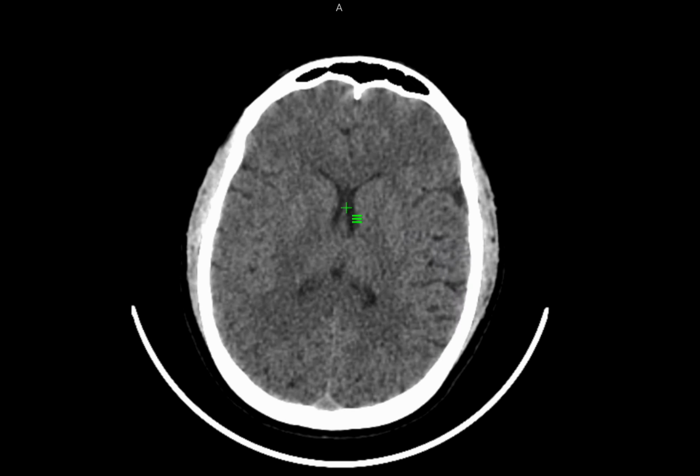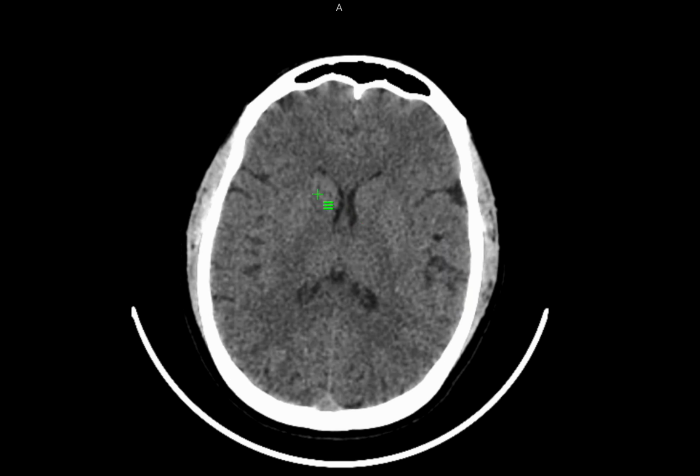So this is the bilateral cerebral hemispheres, and here you have to look at the deep gray nuclei that is found here. That is, this is the caudate nucleus, this will be the lentiform nucleus which looks like a lens, and this is again divided laterally into the putamen and medially into the globus pallidus. Here you will have the thalamus.